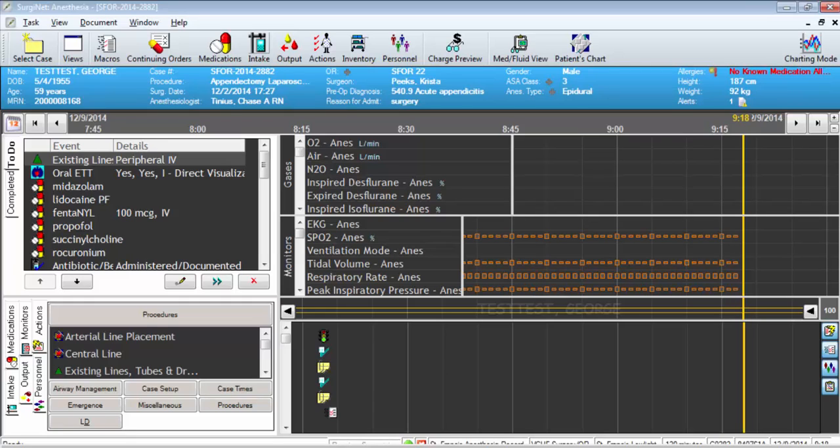First, you will note that the screen was mostly blank prior to launching our macro. The to-do list seen here was empty. After executing our macro, the gases and monitors sections populated with the viewable information on the screen. We also see the first signs of our actions populating to the event log at the bottom.